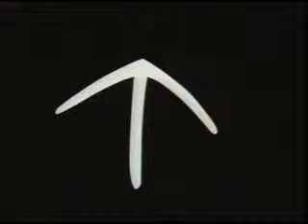I showed you some tracings of the Gothic arch and told you how to interpret them. Note that the very nice Gothic arch may be produced by a patient whose lateral pterygoid muscles on both sides are under tension and, therefore, fix the condyles anterior against the articular tubercles. Thus, the arrow point does not indicate centric, but a protruded jaw relation.